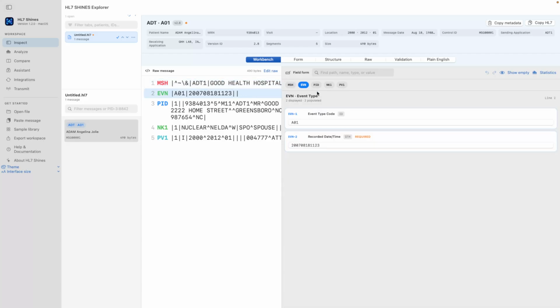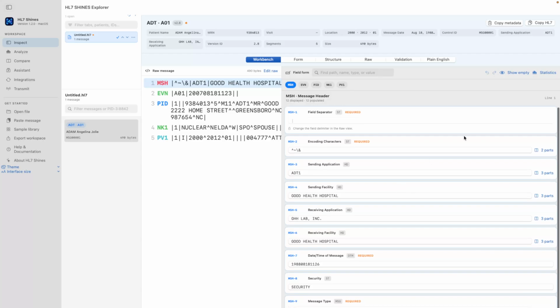Depending upon the HL7 message you paste, you get the data types, the details and everything. The other part is that it even has a show empty fields option. For example, if I remove MSH6, MSH7 and MSH8, and if I click on this, it automatically erases the fields. So I think this would be a bad message to show, but I'll click on hide.